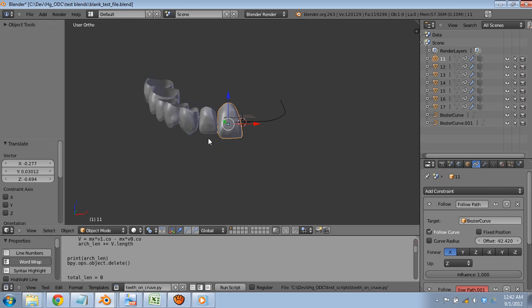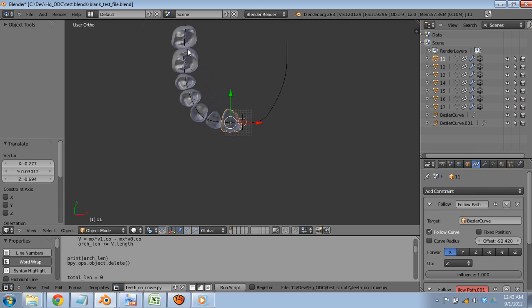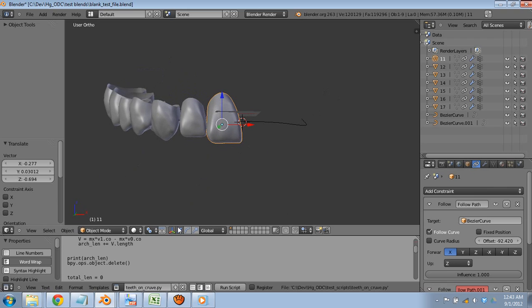And someday it'd be really nice to set the intercanine length on an arch and then the posterior length on an arch, just like if you were picking denture teeth. You could pick the square, tapering, or ovoid arch forms, things like that, and just boom, snap out a rough proposal of an occlusion set. And maybe even if teeth match other teeth and function together, you could have a lingualized setup or a flat plane setup, things like that, just ready to rock and roll. Get you something proposed quickly that you can then tweak into place to get something nice out.